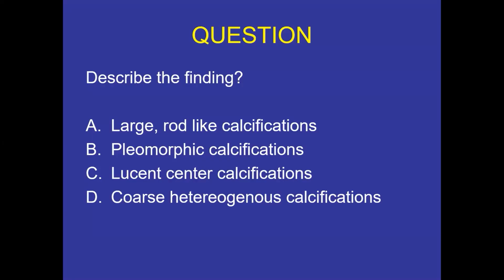Coarse heterogeneous, I know that is a confusing thing for pleomorphic calcifications, but actually I've done this case many times. I've never had the confusion from my participants before, so now I'm going to put another slide in the answers to show you what a coarse heterogeneous calcification is so that we can learn about that. But they're much easier to see, and they almost look like developing popcorn calcifications, okay? So definitely not as fine.